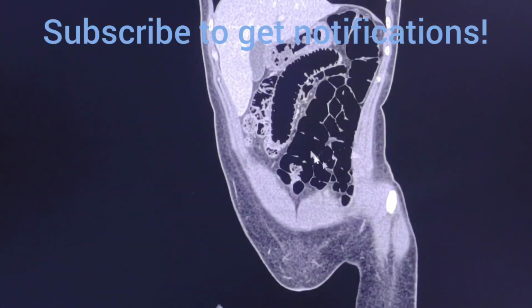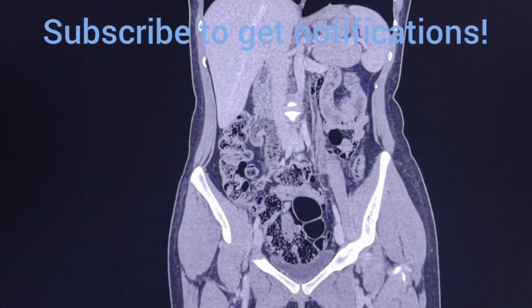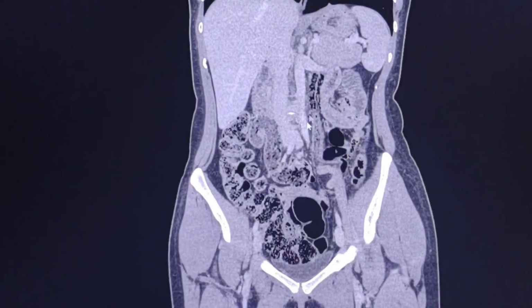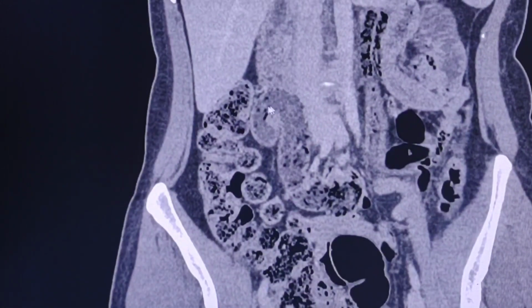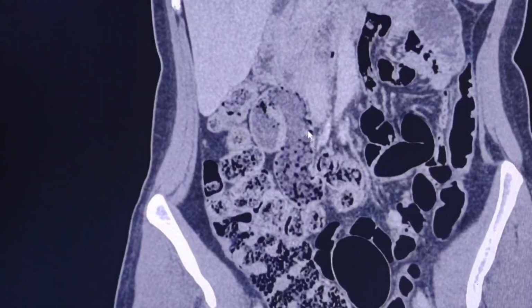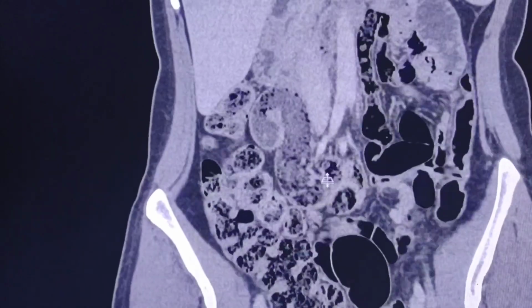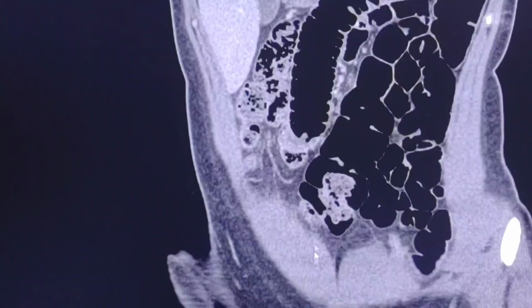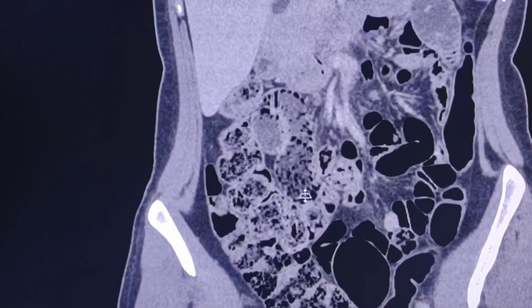As you can see, there is significant dilation of the small bowel, which is intermittent when we analyze the images, and there is significant fecalization of the small bowel. All these are small bowel loops here, with a significant amount of fecal material. So there is dilation of the small bowel and a significant amount of fecal material.